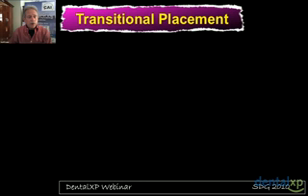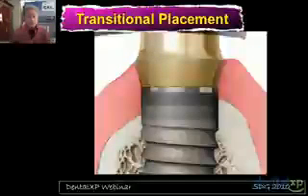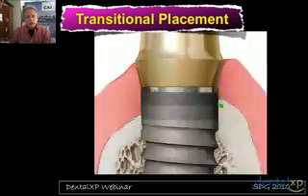I believe, however, that in most cases, as I mentioned very early in this broadcast, the ideal receptor sites really don't exist very often. So most implants are not placed into ideal receptor sites. And in fact, they look more like this, where we have a higher lingual cortical plate and perhaps a lower facial cortical plate of bone. So in order to do that and preserve the bone at its height on the lingual, we're going to place the implant in what we call a transitional placement.